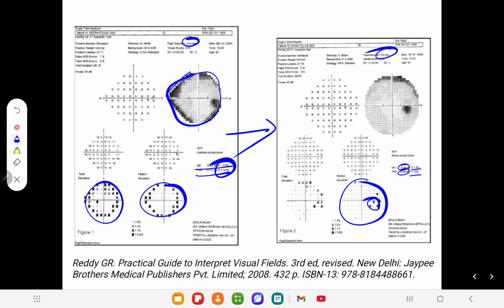It's very, very funny that you can see this change with even a 1 mm difference in diameter. So that's why you understand one thing. Sometimes it is suggested that if the pupil size is so small, like less than 2 mm, dilating and then doing visual fields is better, because a dilated pupil does not cause that much destruction of the visual field compared to a miotic pupil.